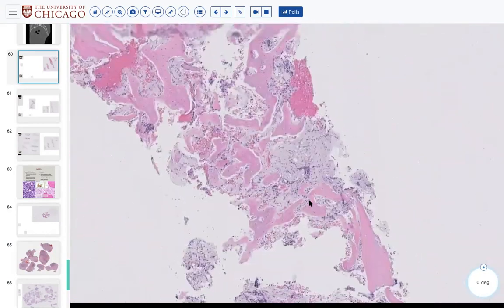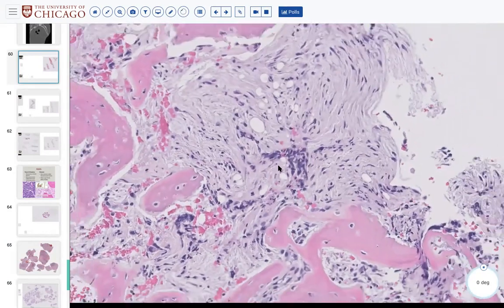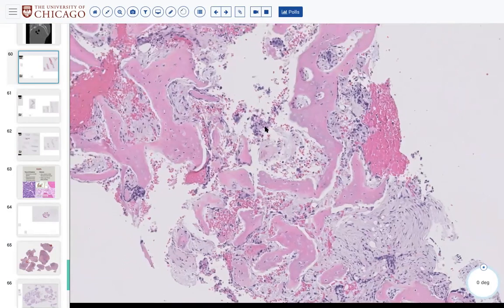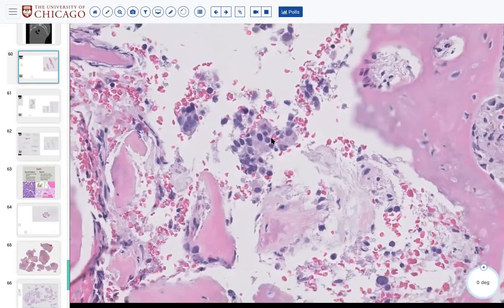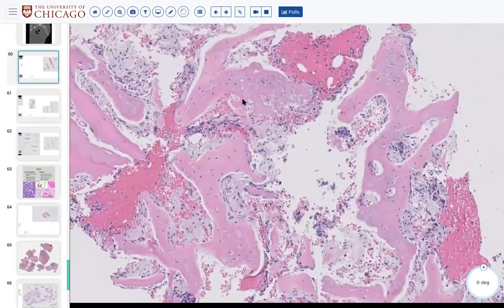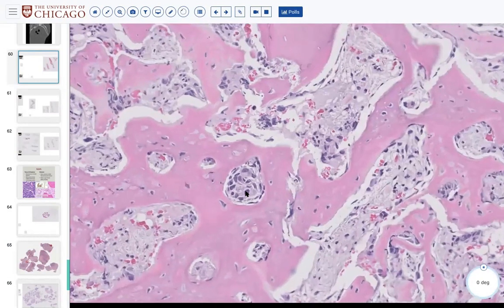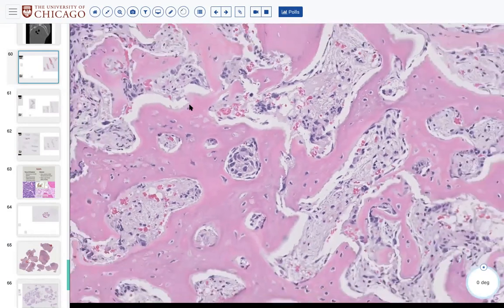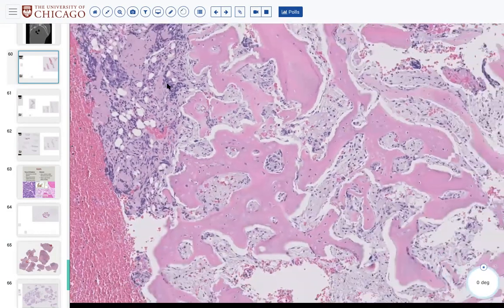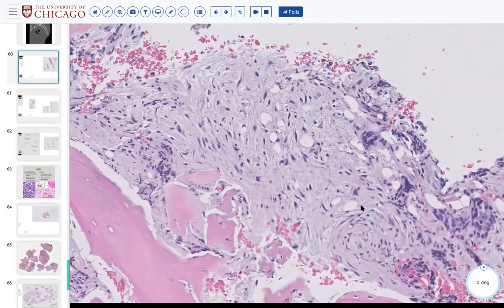In this case, there's obviously something here that is not normal marrow, right? It's these very large pleomorphic appearing cells with prominent nucleoli that are crushed between fibrous stroma. This also happens a lot in the female counterpart, in breast. Sometimes breast cancer is just a few scattered cells, compressed between this fibrous background.